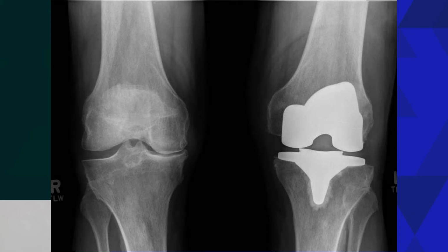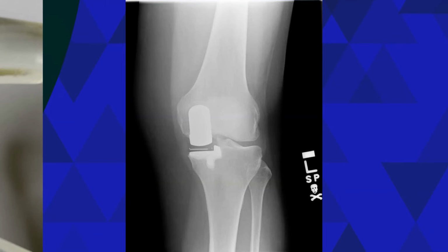Now this knee is straighter and the knee is replaced and no more bone-on-bone contact. And here's a partial knee replacement x-ray. So just the inside aspect of the knee joint is replaced. The outside aspect of the knee and the kneecap or patellofemoral joint is not altered. And so this is the most common partial knee replacement, which is just the inside aspect.